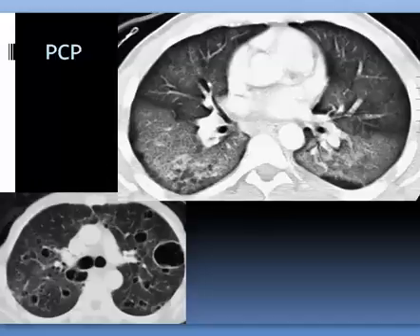Among the differential diagnoses which should be considered in emergency non-traumatic chest conditions is pneumocystis carinii pneumonia, in which you find diffuse consolidation with multiple cystic areas and multiple reticulations within the lung in a patient with AIDS. Thank you.